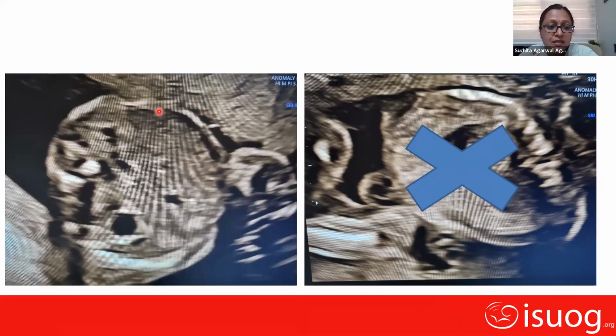So what about this? This is actually a circular structure. I see a good stomach also. I see a small umbilical vein, but the problem is I see a kidney over here. So this is again a wrong plane. Kidneys should not be visualized in the AC plane. So it's not a perfect AC plane when the kidneys are visualized.